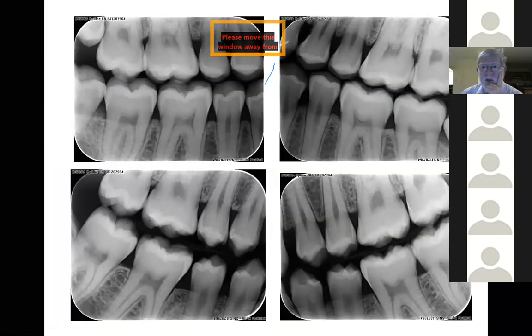So the significance of being able to use the bite-wing tab is that when the patient closes, the upper and lower teeth are pretty much approximating to each other. So if this patient had a DO filling that needed to be done on 36, you look at the radiograph and you'll say, well, I've got to make absolutely sure that when I build this up, I'm not going to leave that marginal ridge there. I'm going to make sure I bring it down, because if I don't, that tooth is going to smash away my filling.